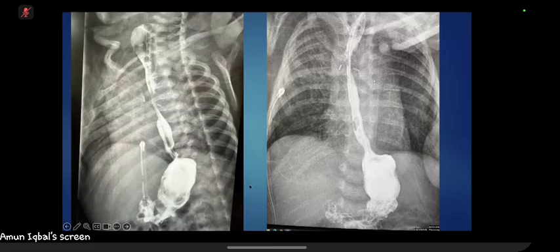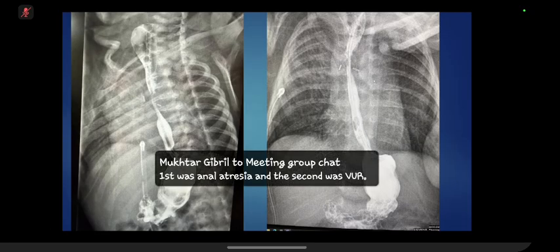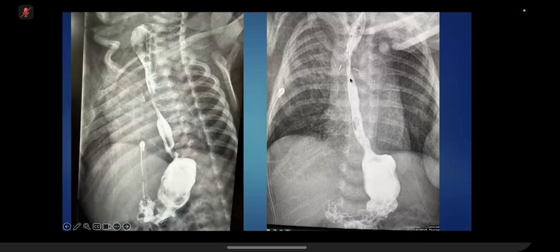Okay. But even if it is within the 2 weeks post-operative period, you want to say that this can be within the expected post-operative findings, right? Because they have operated there, they have closed communication, and there are some surgical clips over there. But when you observe on the fluoroscopy study, the contrast is smoothly passing, and there was definitely no communication, right? Yes.